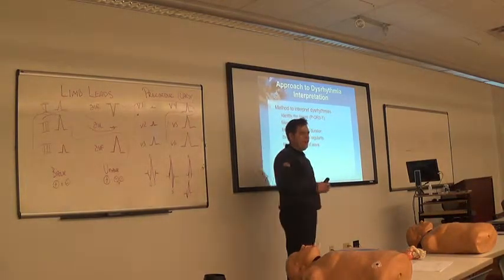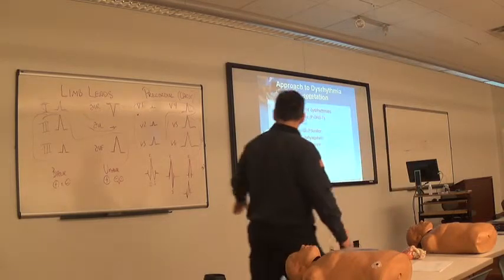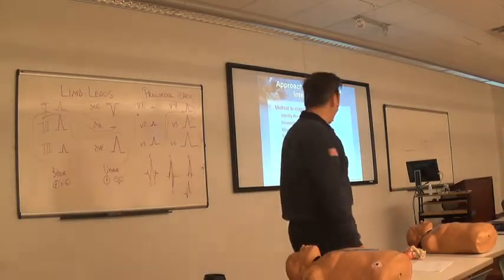How wide is that QRS? From the beginning of the Q to the end of the S, or the beginning of the R, whichever one I have in these examples right here. It's 0.12. Max is 0.12. Okay?